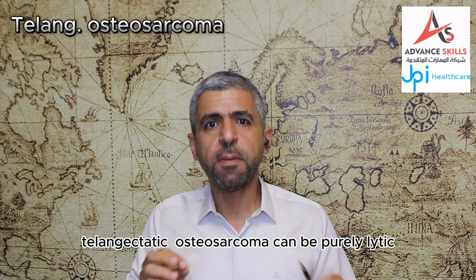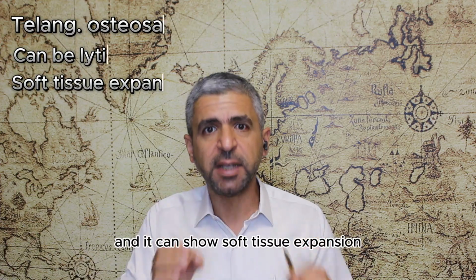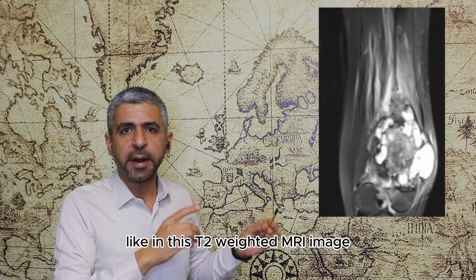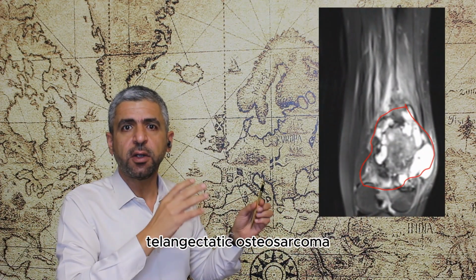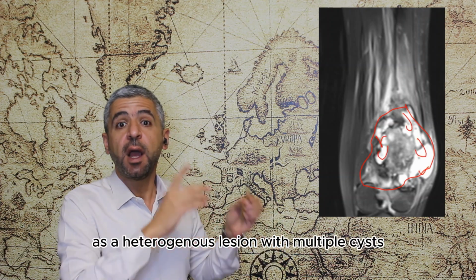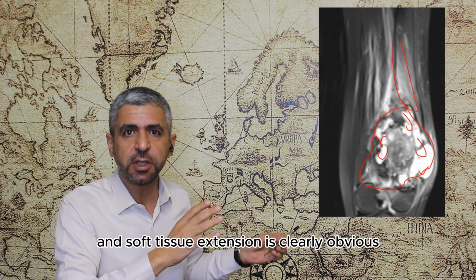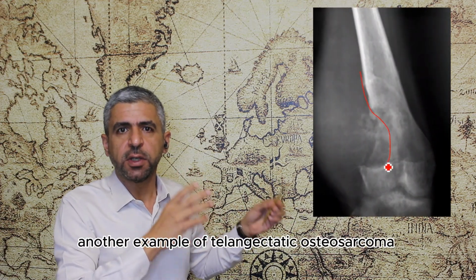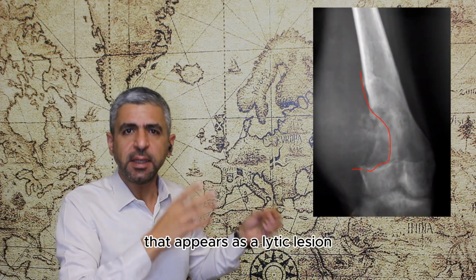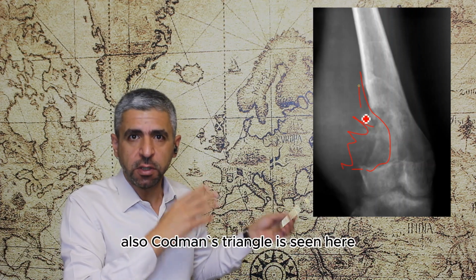Telangiectatic osteosarcoma can be purely lytic, and it can show soft tissue expansion. Like in this T2-weighted MRI image, we can see telangiectatic osteosarcoma as a heterogeneous lesion with multiple cysts. However, no fluid levels are seen, and soft tissue extension is clearly obvious. Another example of telangiectatic osteosarcoma that appears as a lytic lesion with evidence of soft tissue extension, also Codman triangle, is seen here.